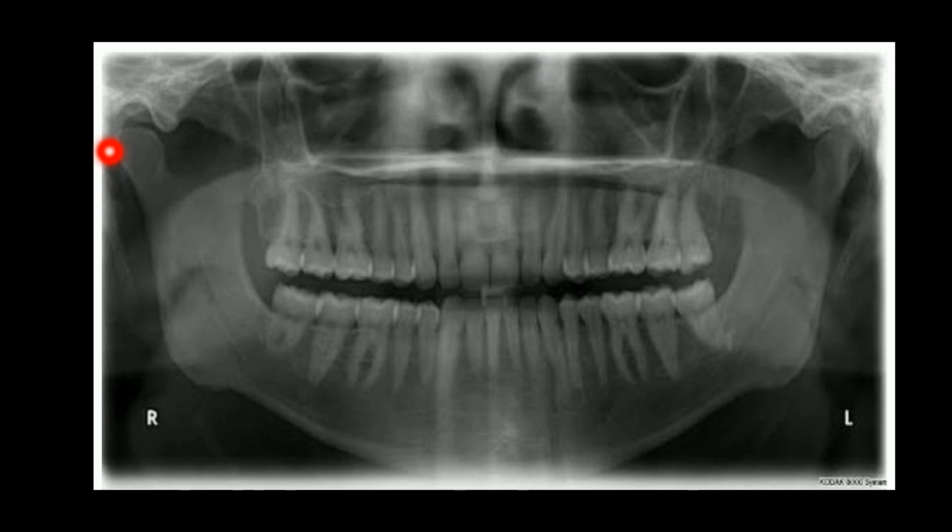We change to a much better picture. So this cavity present here is glenoid fossa, and followed by you have articular eminence. Just behind the articular eminence we have a radiopaque shadow kind of structure, which is nothing but your lateral pterygoid plates. Now this radiolucent line is making a teardrop shaped appearance. Okay, so this is nothing but your pterygomaxillary fissure present. This as a whole is a zygoma.